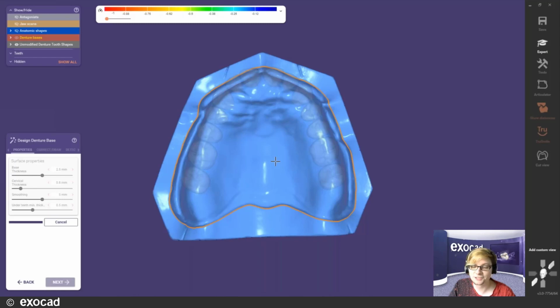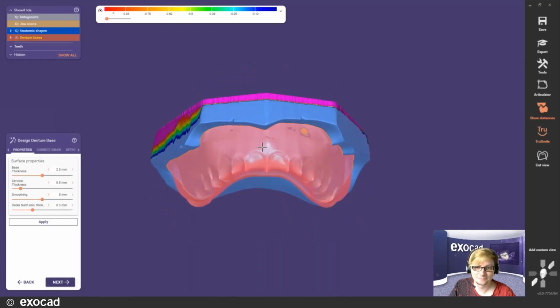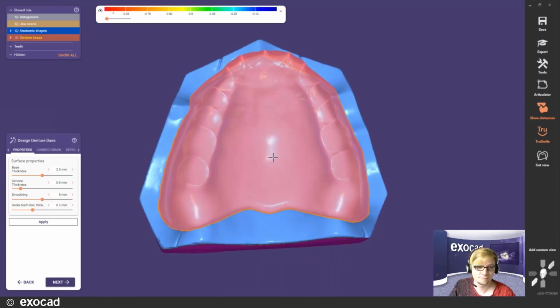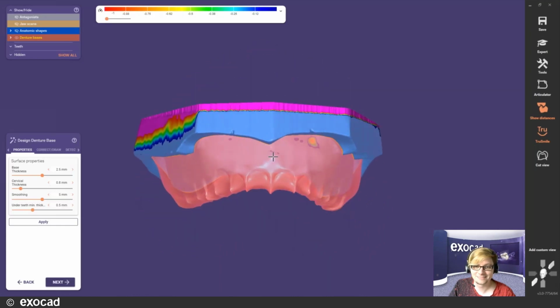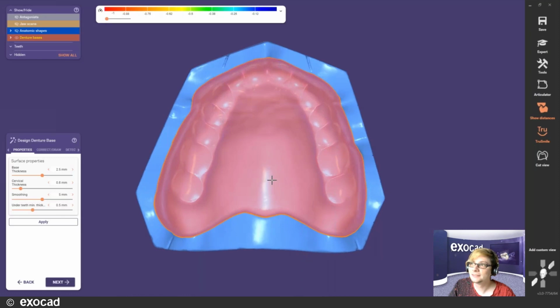Are there any questions already while we're waiting for the calculation? Well, so far we only have a question about the articulation, but we will handle that. And besides that, one question was will instant anatomic morphing be available for scalable teeth?